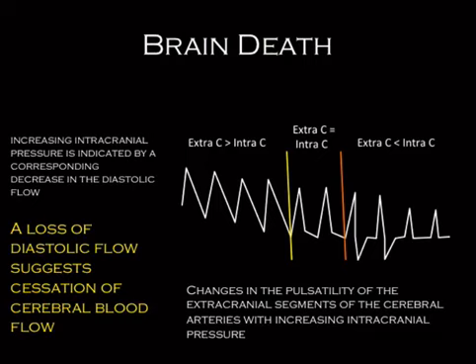So you basically end up creating the external carotid, the internal carotid ends up looking like the external carotid, and then eventually the external carotid will have an even lesser resistance waveform than the internal carotid when it's very bad. But basically, the bottom line is loss of diastolic flow equals a brain that's off. High resistance waveform in the internal carotid means something terrible has happened.